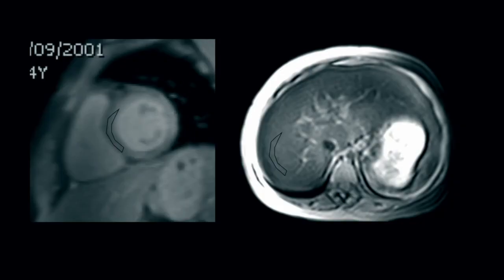To go with the calculation, you have to draw an ROI in the myocardial as well as liver slices. In the myocardium, to draw an ROI, the mid septum is preferable as it is less amenable to motion. The ROI should include as much of the myocardium as possible.